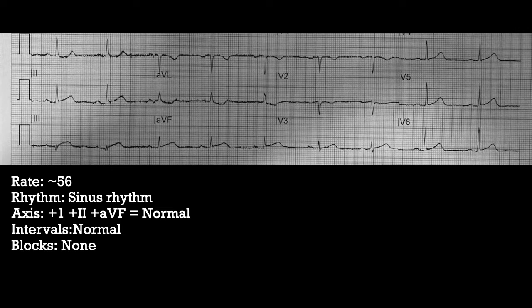Now let's look for ischemia and infarcts, i.e. let's look at the ST segment first. We're looking for ischemia, and then we'll look for STEMI itself. ST segments and T waves. We don't see a whole lot of change there. And you can do it based on however you want. I'll tell you what, let's start with the precordial leads. So we're looking at anterior leads because this follows a vascular distribution. Looking in the anterior segment, we don't see any obvious ST changes. There's a little bit of T wave inversion there.